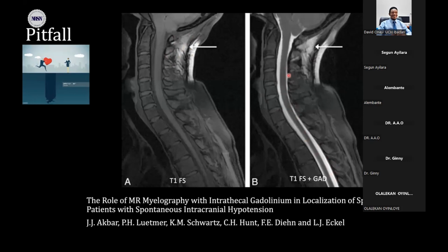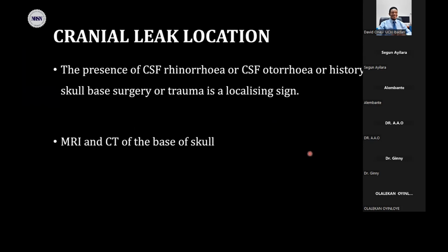The leak may be occurring at this level, but because the fluid finds itself in the epidural space, it then extends along the dependent portions of the spine and travels longer distances along the epidural space of the thecal sac.